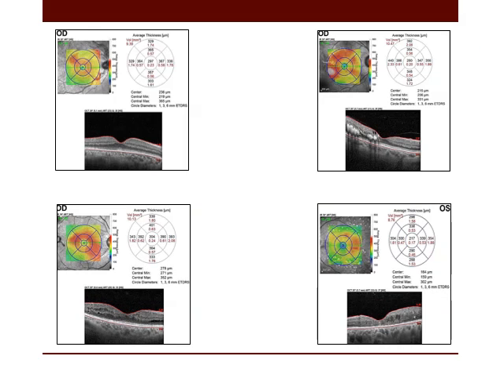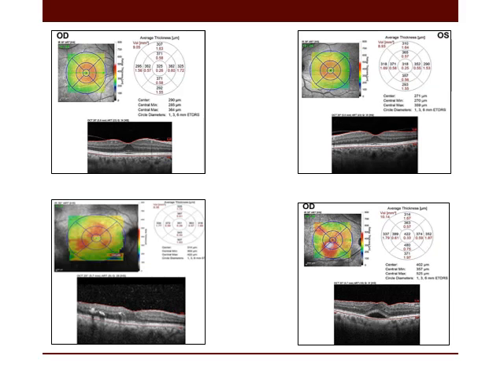Again, this is a patient with central sparing diffuse spongy thickening, and the same in these other cases. And what about these small cysts? Is this a cystic thickening? I prefer to describe it as central involving diffuse spongy thickening with small cysts seen around the fovea rather than cystic foveal thickening.